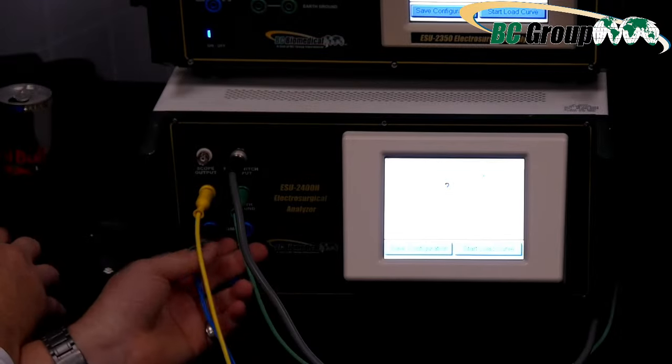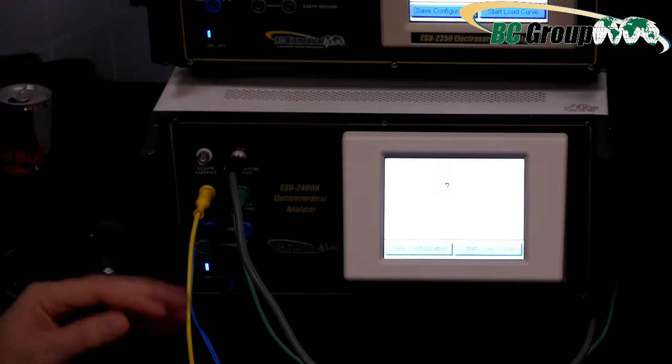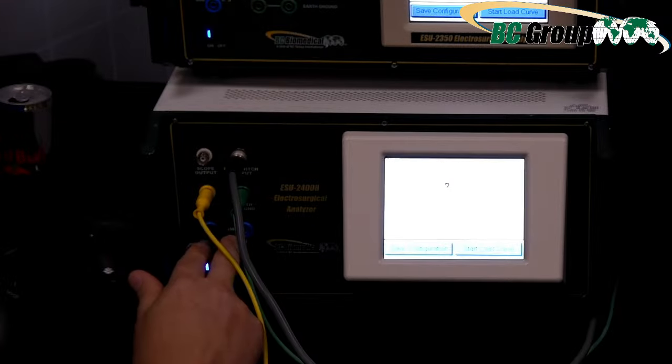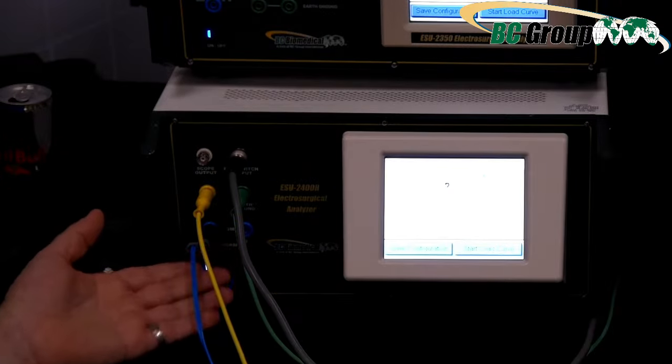So right here are my CQM ports. There are 2 of them. The reason there are 2 is because when we take our resistance measurement and we set and test those alarms, which we will do in a minute, we use both those ports. But for these kinds of measurements, when you're just checking for the output, you're only going to have it plugged into 1.